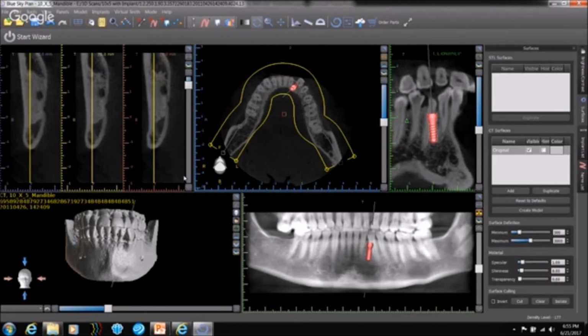Okay. There's a density level measurement on the lower right corner of the page you are showing. Is that measurement useful? No. If it is CBCT, no. If it is a regular CT, yes. That is exactly the density level, when we talked about the Hounsfield units and as such. So far, there's no correlation between those numbers and the tissue density as such.